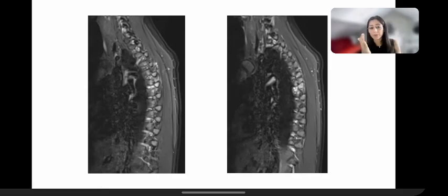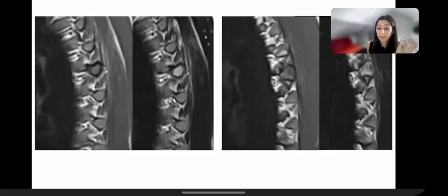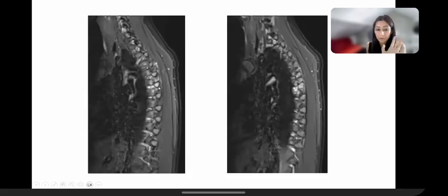So generally, when you're reporting your spine scans, go to the far lateral and always look at the costotransverse and costovertebral joints. Normally, you can see involvement of those joints in cases of spondyloarthropathy. Sometimes that's the only clue. Everything is normal, but your costotransverse joint is eroded.